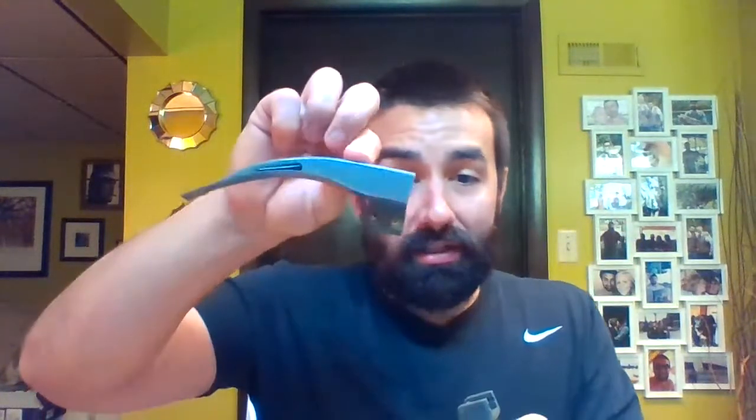So we need a handle, which is essentially our power and light source. It's going to power up our light source, I should say, and then there's a bulb on the blade itself. One is no good without the other, and it's important to know how to identify these different blades and how they work.